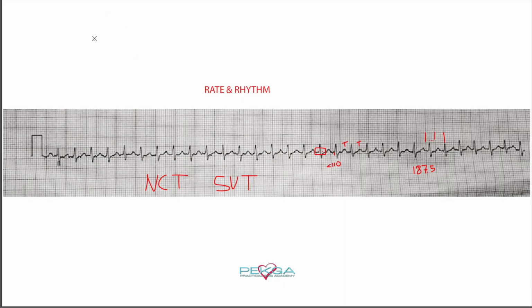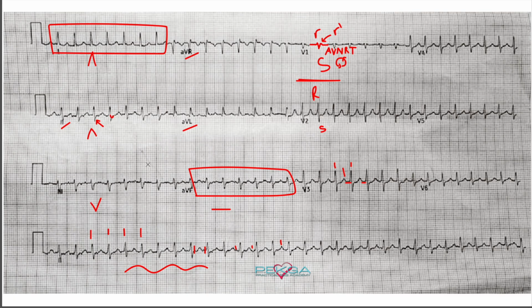You're handed an ECG that is fast. It has a narrow QRS complex. Axis deviation is normal. We are showing a little R prime up here, so this would indicate that this is AVNRT. And the difference between AVNRT and AVRT is complex.